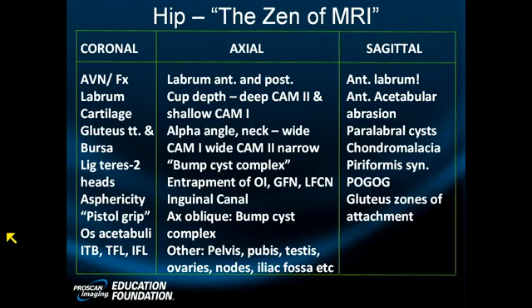The literature, especially the orthopedic literature and the anatomic literature, says that sulci are most conspicuous antero-inferiorly, in the antero-inferior quadrant.